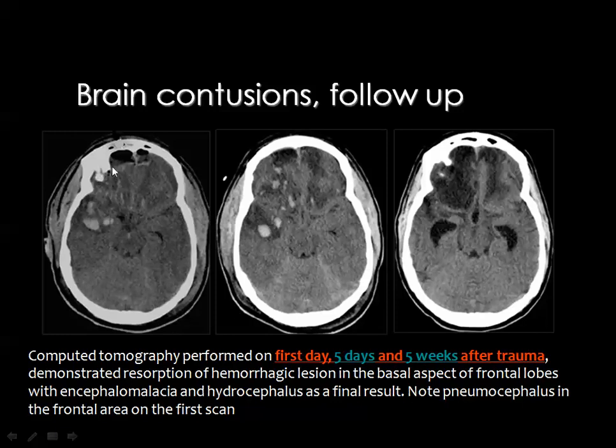In the acute stage, you can see a swelling of the brain tissue, diffuse hypodensity with foci of hyperdensity representing the hemorrhage inside the contusion. Later on, the swelling will start to regress, but you still see the hypodensity and the hemorrhagic foci.